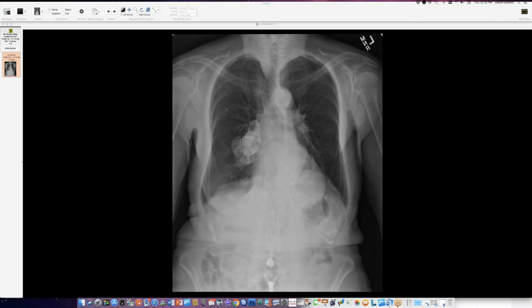Yeah. I think the rim calcification and the whiteness but lower attenuation inside goes nicely with that milk of calcium idea. Yeah. Okay. Nice. Caseous necrosis, milk of calcium combo. Yeah. Okay.